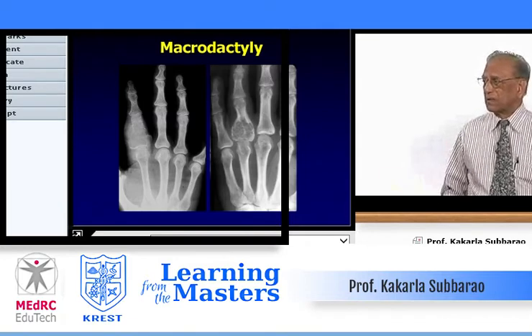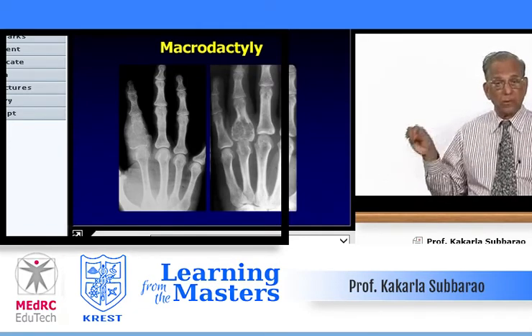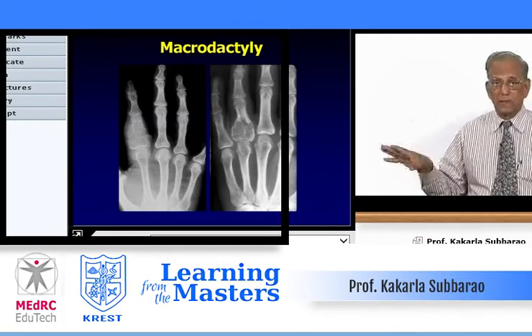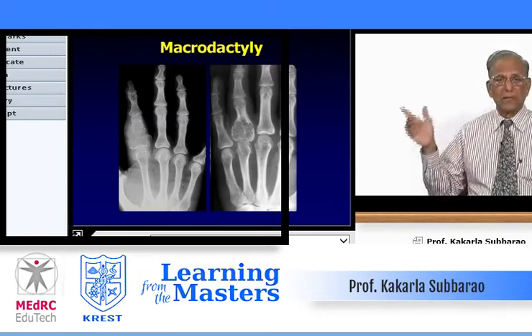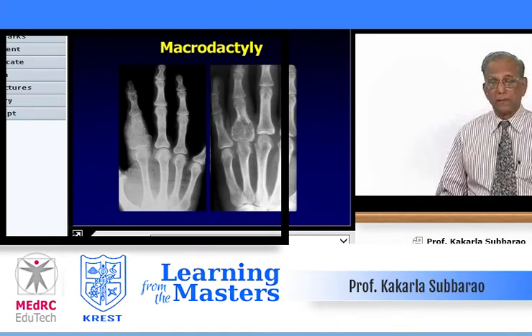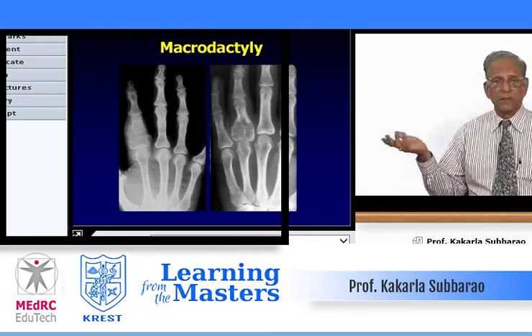The one on your right side is classical of a giant cell tumor. There is no calcification in the center to think of an enchondroma, although enchondromata are more common in the hands and feet, but this does not contain the classical calcification we have described earlier, namely rings, arcs, and nuggets, and only residual trabeculae are there, and the lesion is expanding all the way to the articular margin, classical of a giant cell tumor. Keep it in the distal end of the radius, it will be classical. Lower end of the femur, proximal part of the tibia, classical of a giant cell tumor.